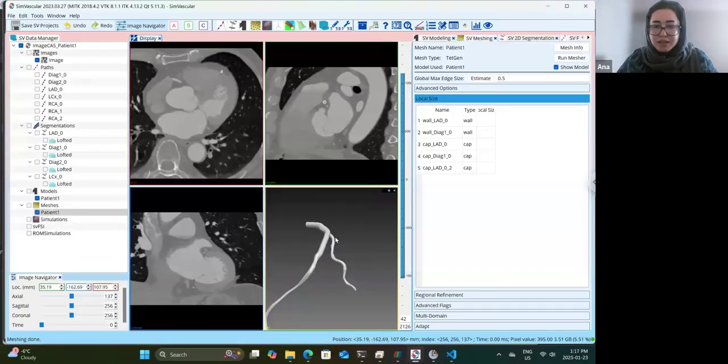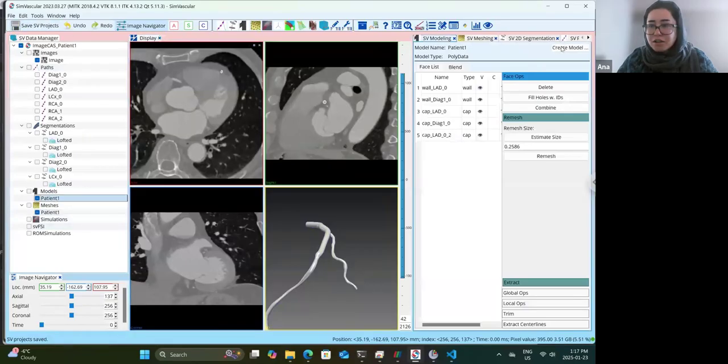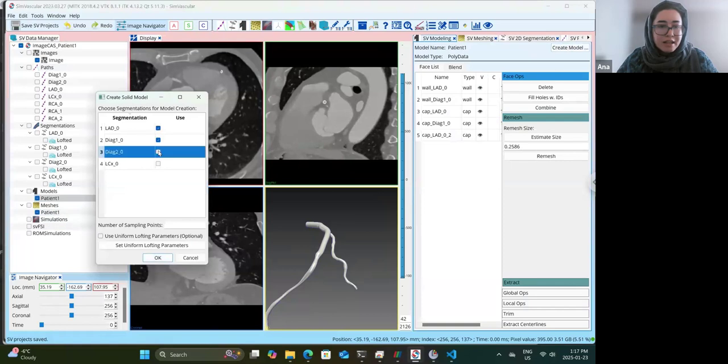So again, I know that LAD and diag1 are not making any problem for us. So let's add diag2.